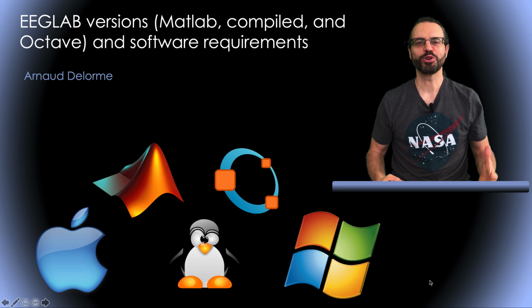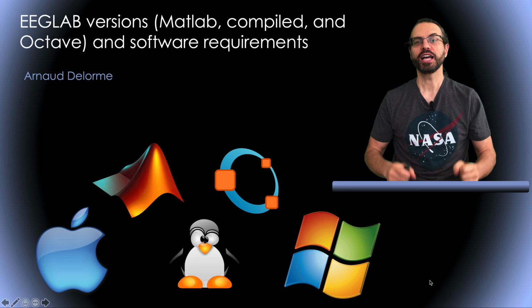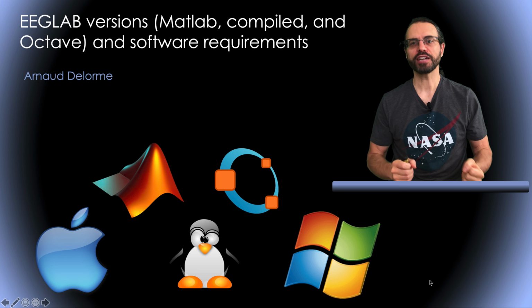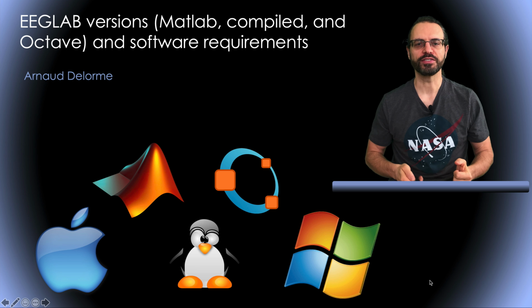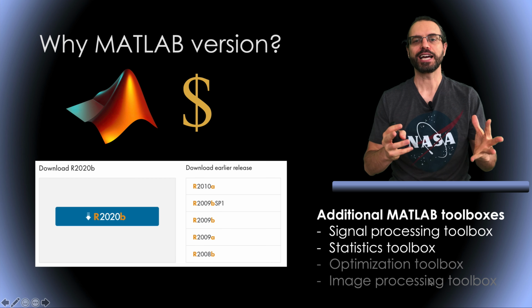Hello, my name is Arnaud Delorme, and this presentation is about comparing different ways of running EEGLAB, either using Matlab, using the compiled version of EEGLAB, or using Octave. The preferred way to run EEGLAB is on Matlab.